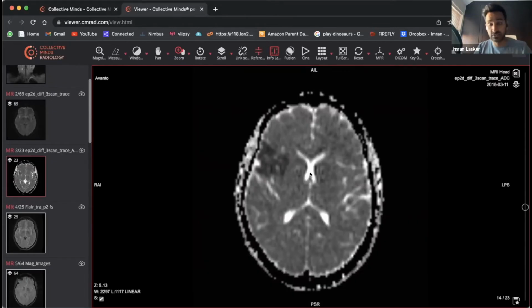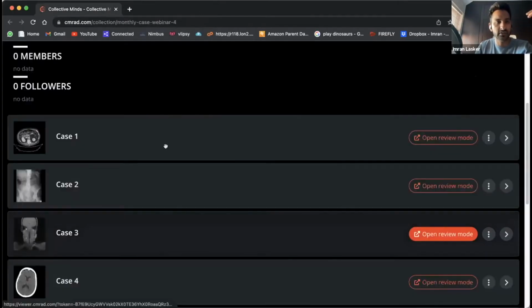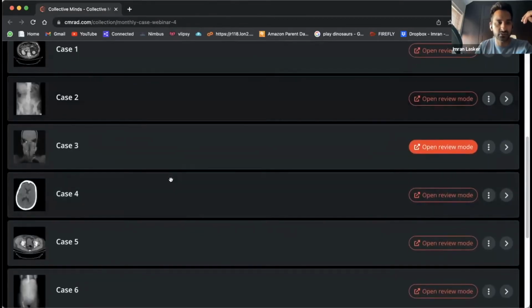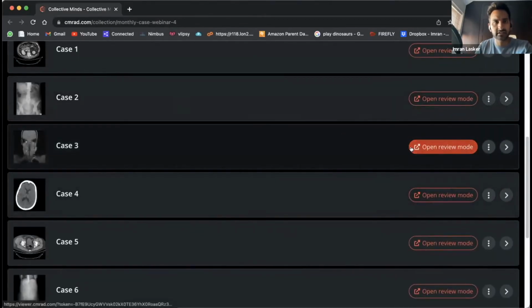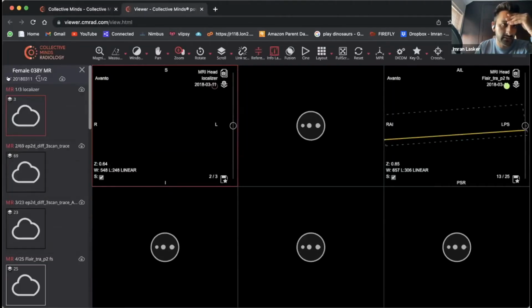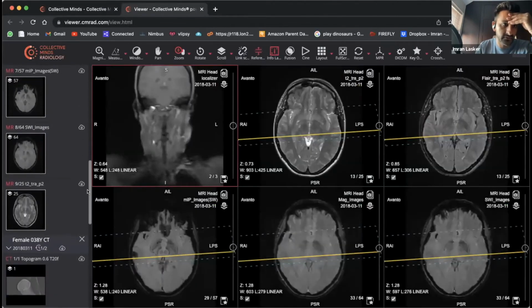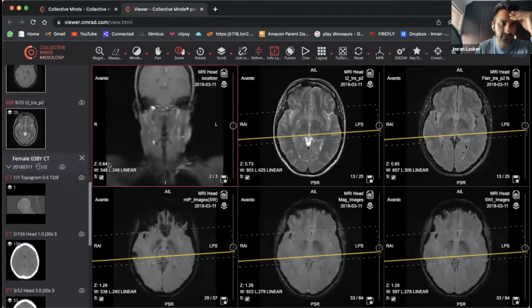In this particular case, we've actually got the MRI scan to prove what we saw. I think with this patient, they had continued weakness and a really strong clinical suspicion. They thrombolysed, and then also did an MRI scan to try and characterize it more, and that's what they found. Let me just see if we had an MRA, sometimes you get one. I can't remember now. Apologies if we don't, I can't see it. Okay, fine.